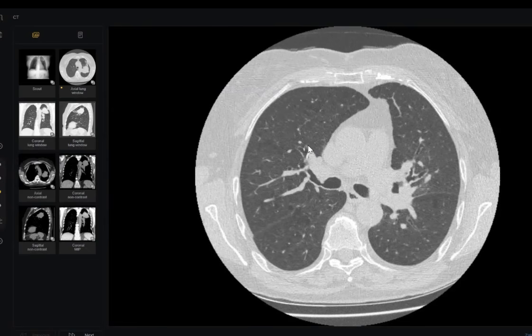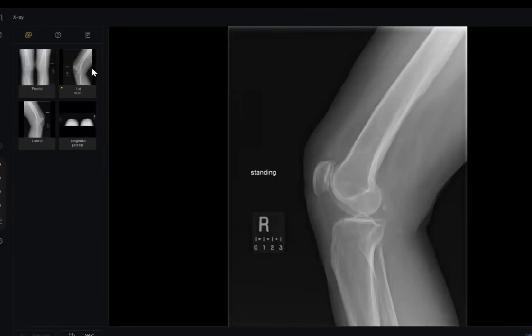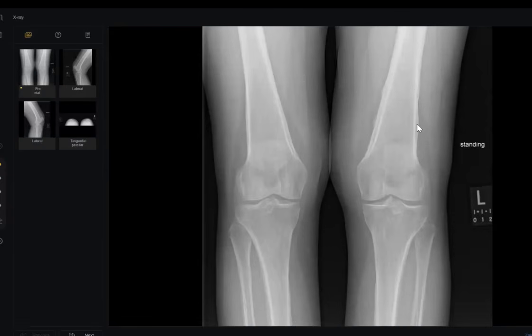You did very well. If I am the examiner, I will pass you. You are confident, clear, and concise. Let's start from the first image. This is a case of trauma, but there are incidental findings. Hypertrophic pulmonary osteoarthropathy.